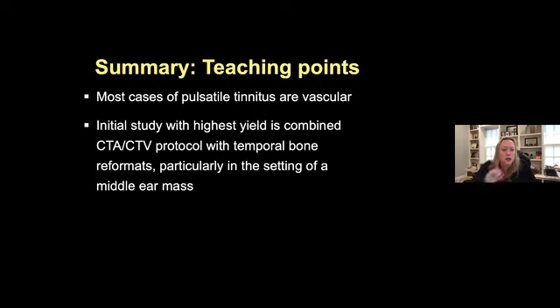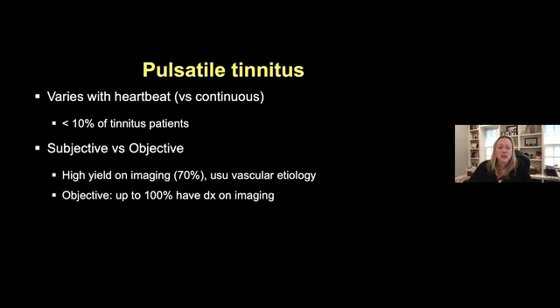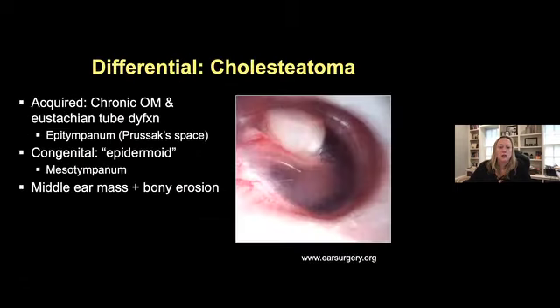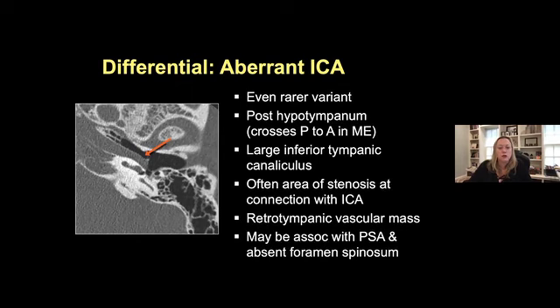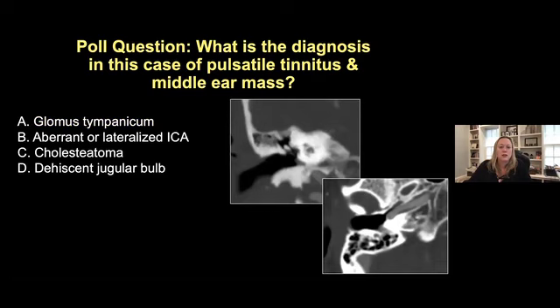Okay, first one. What's the difference between bony dehiscence versus bony destruction or erosion? Very good question. It's very confusing at times. I'm going to try to go back and show a picture, and I think a picture is worth a thousand words. To me, dehiscence is something that takes a long time to develop. It's adjacent to an expansile process. You get expansion and remodeling of the walls, and then over time, you get focal areas of dehiscence.